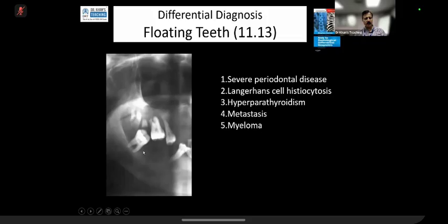So what happens is that the gum and the margin of it is sort of eroded, or it might be very osteoporotic. So radiologically speaking, it's not visible, and a radiograph will tell you as if the teeth are floating in air like this.